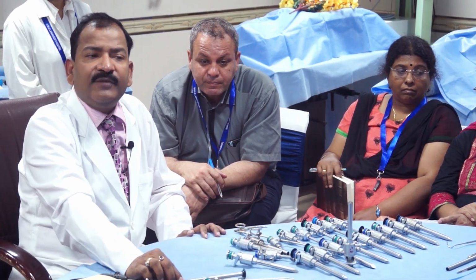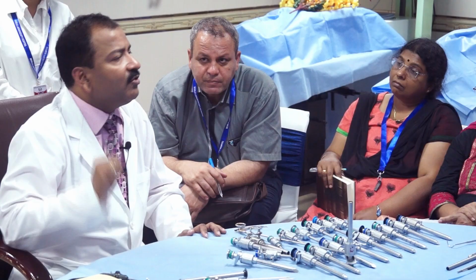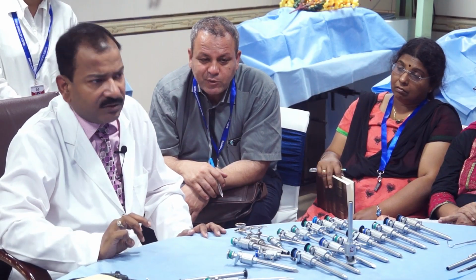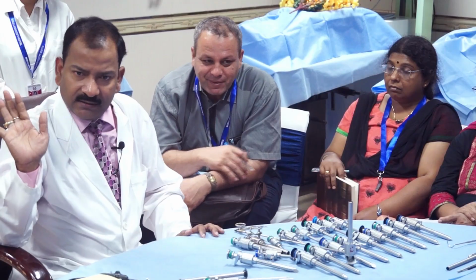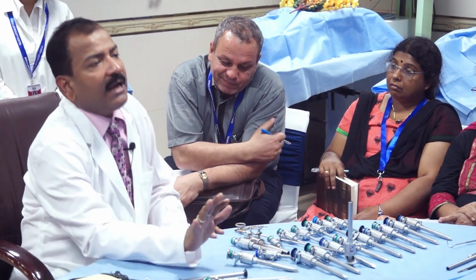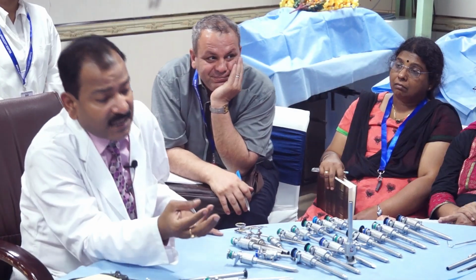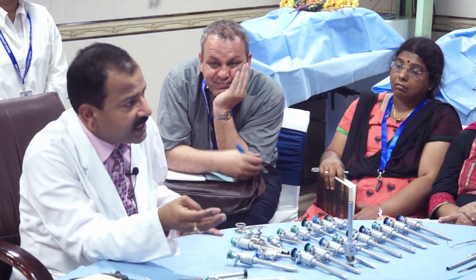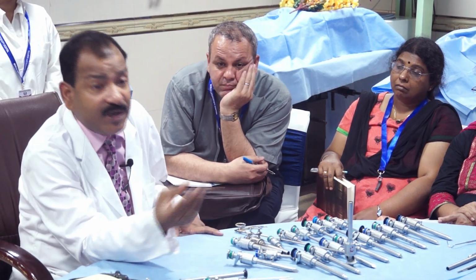You have to go deep into the engineering. Do you know, if I ask you about the camera, most of the people, what they know about the camera is only how to switch on, switch off, then white balancing, and then focusing. That is all. Nobody knows anything else. Discussing the camera takes 2 hours. Camera has aperture, camera has fibroscope filter, camera has shutter speed, camera has red gain, blue gain, green gain, camera has different types of windows, and what else, and you have to adjust.